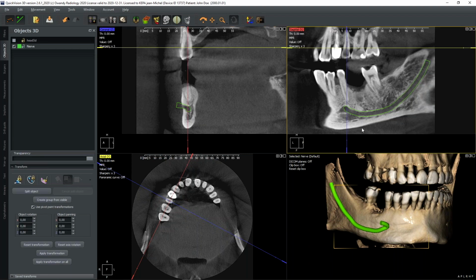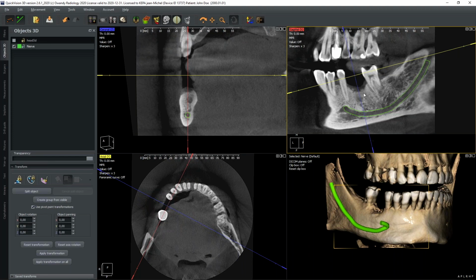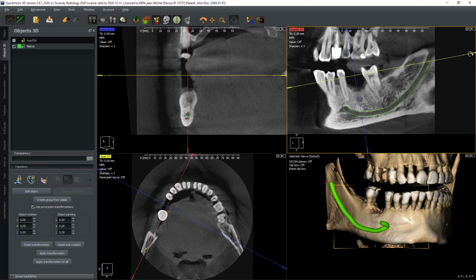Next step will be to do a measurement on that area, and everybody could see one tooth is missing. Now this is a 46, and we will measure that area here. First, I align in a way to be more or less the axial view parallel to the crowns, and I will measure that area here. And that area here, this is what we could see here.